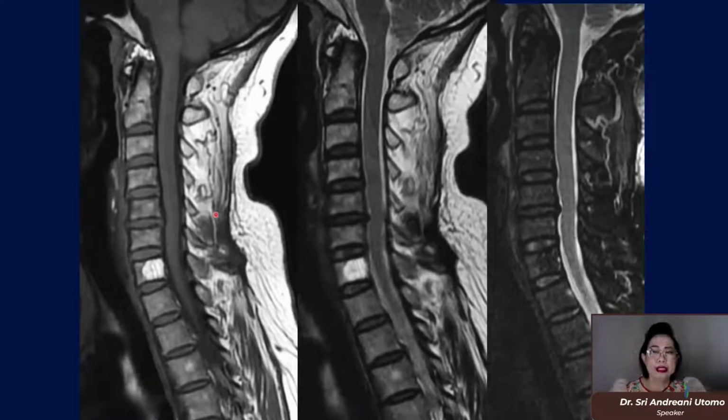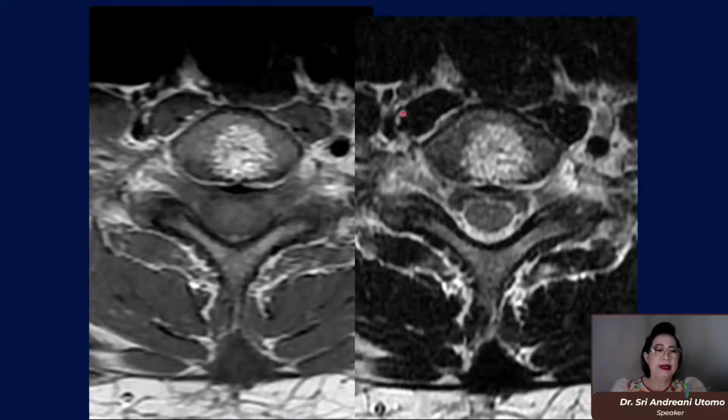Okay, now let's see how this looks in T1, T2, and STIR imaging. We can see in T1 and T2 there is prominence of the vertical bone trabeculation here with adjacent fatty changes. It shows hyperintense signal, and in STIR imaging, there is saturation of the fat and it shows hypointensity. In axial, we can see there is a polka dot sign with adjacent fatty changes.